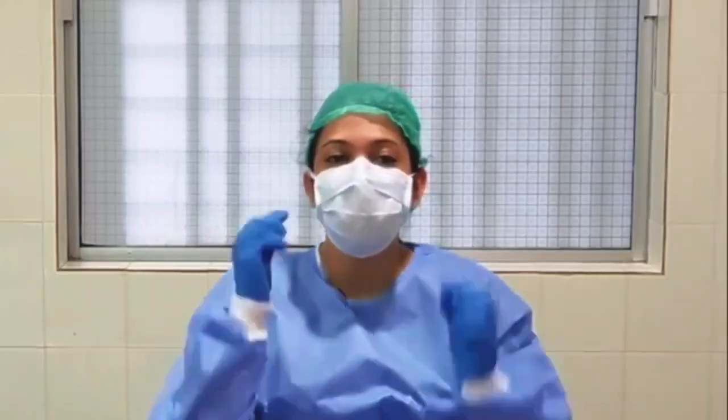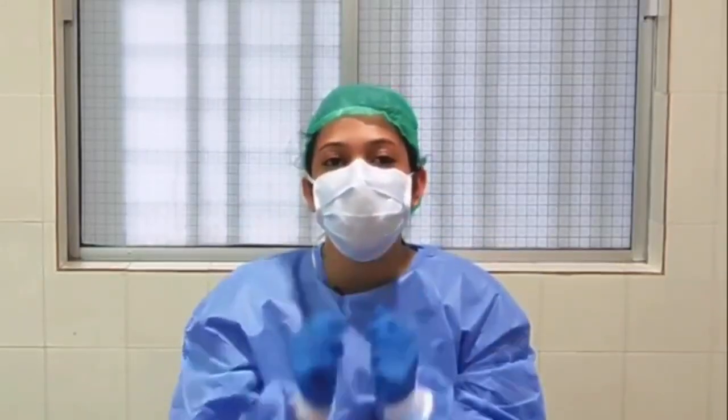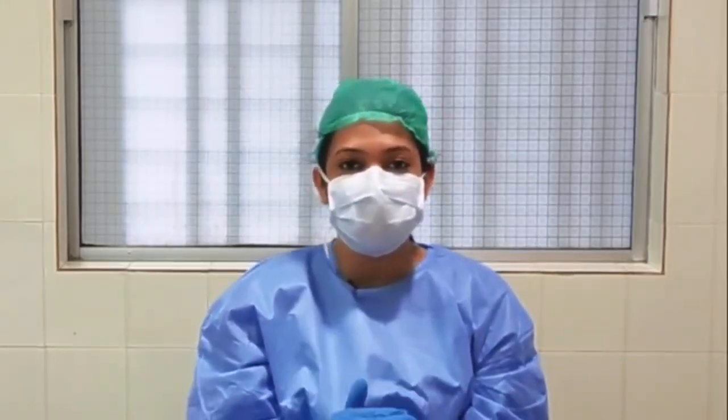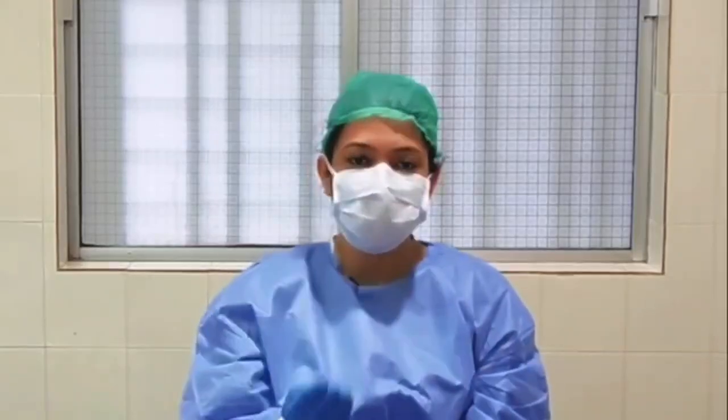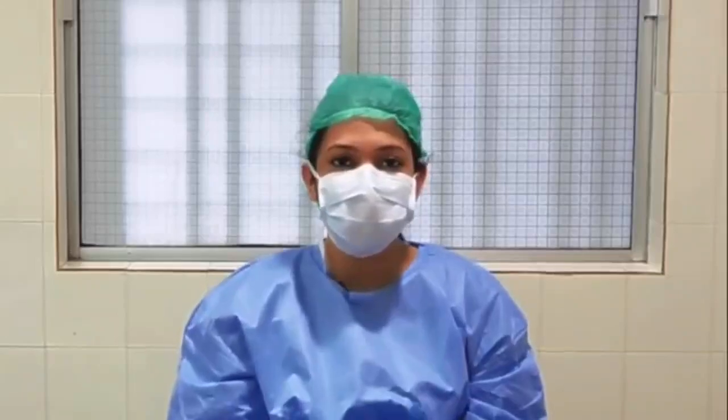This mask has a pore size of 3 microns. The disadvantage of this mask is that it cannot completely prevent leaks from the sides and the lower portion. It can be used by medical caretakers and the patient's own bystanders, but it doesn't prevent the bystanders or the patient caretakers from getting infected. It can only be used by the patient, or if the medical professional is sick, to prevent others getting infected. It cannot protect the person wearing the mask from getting infected.